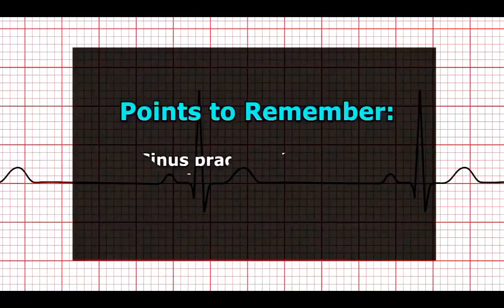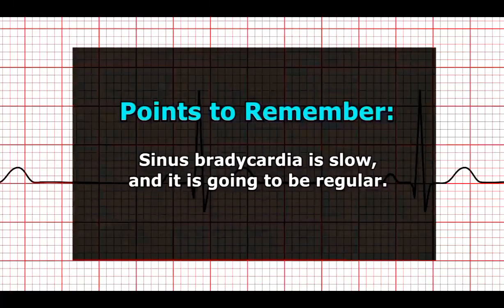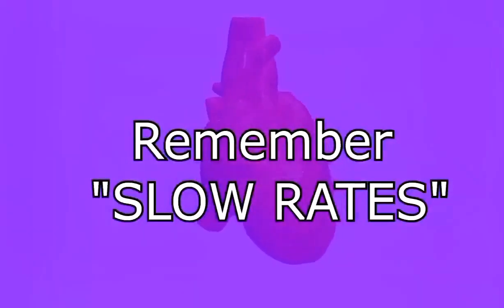So a big thing you want to remember about sinus bradycardia is that it is slow and it's going to be regular. Now let's look at the causes of sinus bradycardia. What could cause the heart to beat at a slow rate? Well, there are many causes of this. So to help us remember those causes, let's remember the word slow rates.